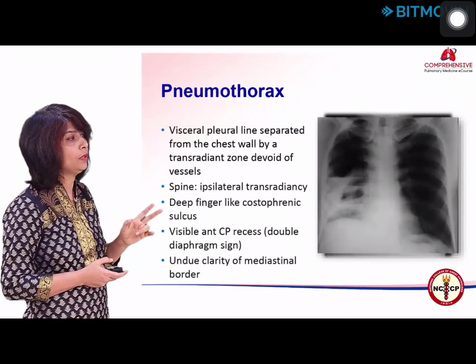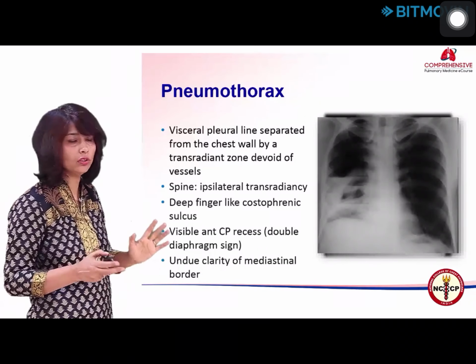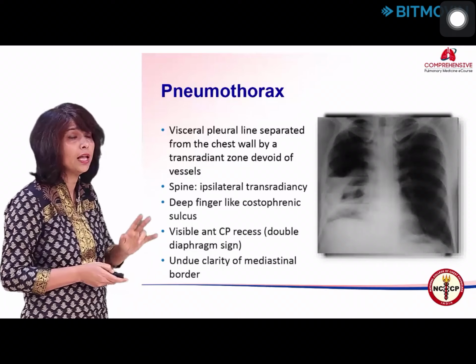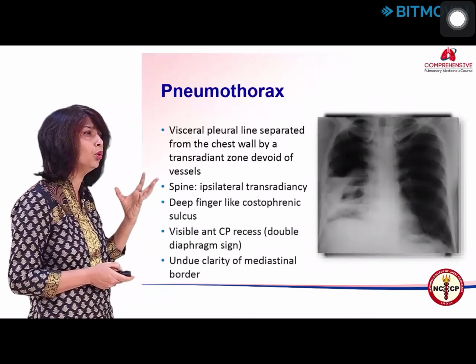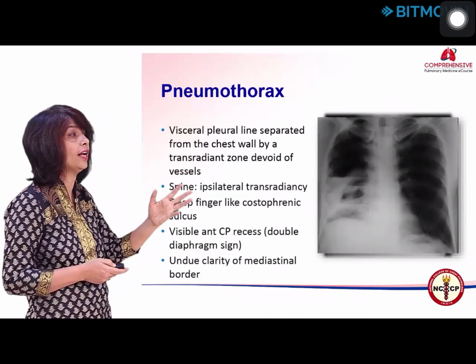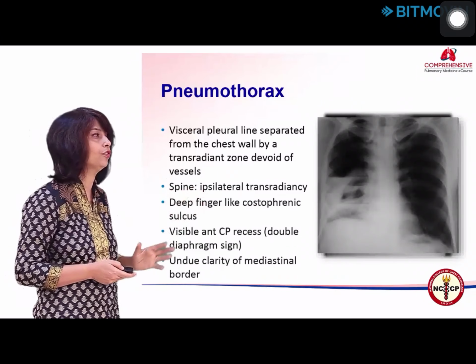So broadly we will be able to tell whether it's lung or pleura, but if it's both, it will show the long fluid level which we saw earlier of the pleural pathology. Yes, lung versus pleura we can sort out, bulla versus loculated pneumothorax, because the bullae only rupture. So bulla versus pneumothorax, lung abscess versus pneumothorax, it's very useful to do a lateral radiograph.